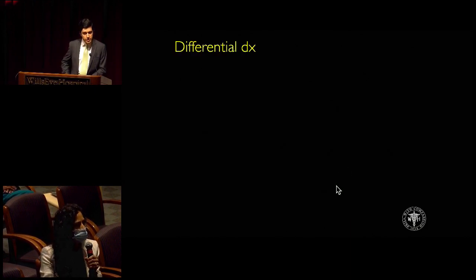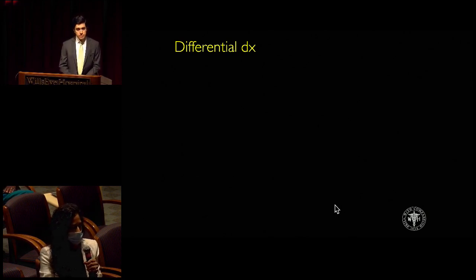So what would be on your differential? Yeah, so, initially looking at the color fundus photo, and I see the radial pattern, it almost initially made me think of a macular star. So whenever you see that, I always think of things like neuroretinitis, hypertensive retinopathy sometimes can look like that, especially in the presence of disc edema. However, when you look at the OCT image, you don't see any true exudates to suggest a true macular star in the sense. And the changes we saw in the OCT look more like schisis-like changes.